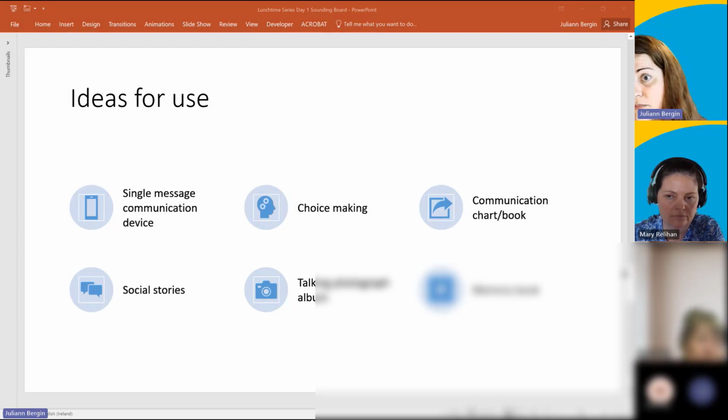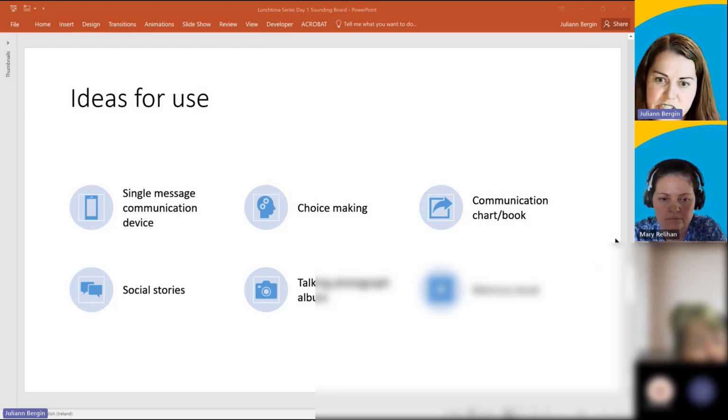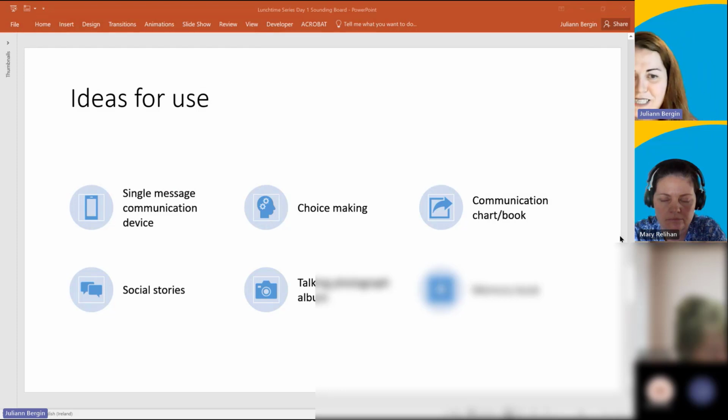Take into account that somebody might want more social information in there. I didn't get a chance to put in phrases like hello, how are you? I've got news. What did you get up to at the weekend? You could also use it for social stories if you wanted to have a lot of single message, single button pages linking to each other, but there's easier ways. Mary will be demonstrating one of those later on in the week.